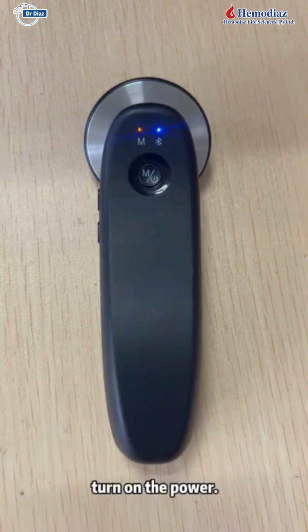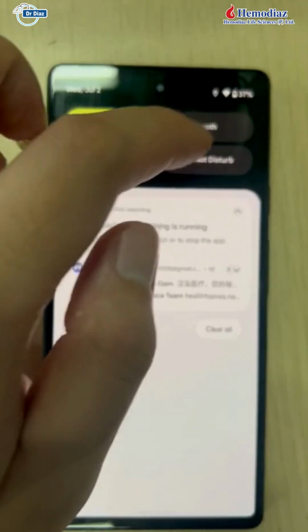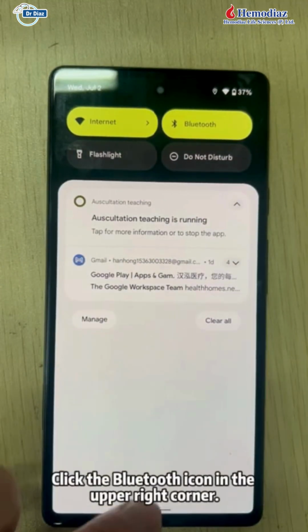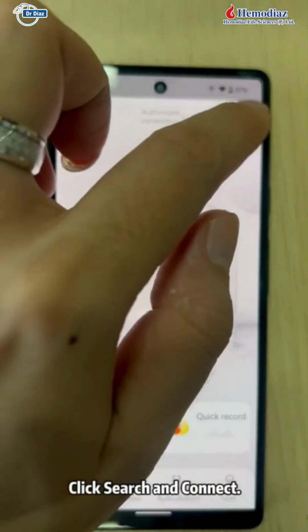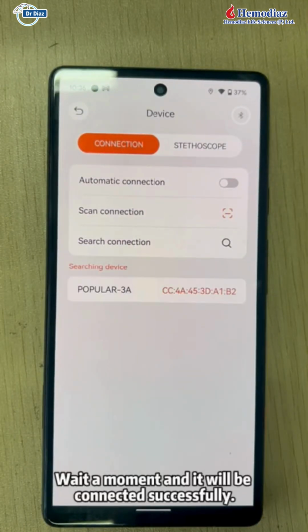Press the switch. Turn on the power. The Bluetooth light is flashing. Open your phone. The Bluetooth switch is green. Open the app interface. Click the Bluetooth icon in the upper right corner. Click Search and Connect. Click on the device model that appears. Wait a moment and it will be connected successfully.